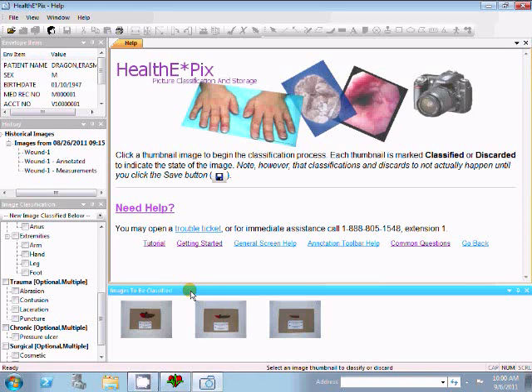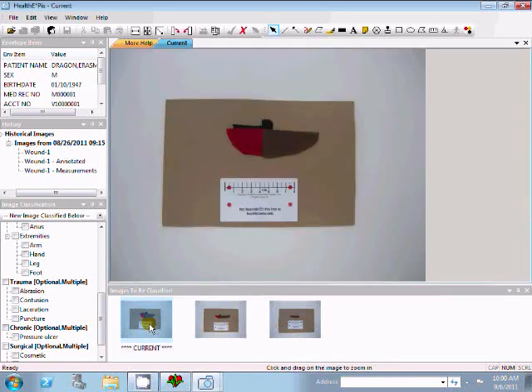I can click on one and start the image import and classification progress, and the full picture is displayed in the New tab pane over the help text. Note that the Help is still there in its own tab. I can click Help in the current image to toggle back and forth.